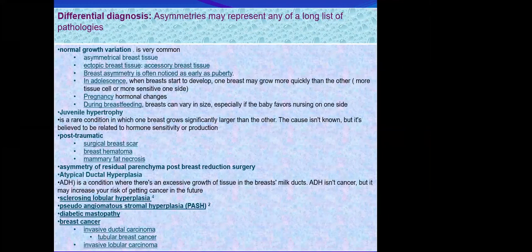And we brought these slides, including a long list of pathology from benign to malignant that can present as mammographic asymmetric findings. And we said according to the 5th edition of BI-RADS, there are 4 asymmetries. What are these 4 asymmetries?